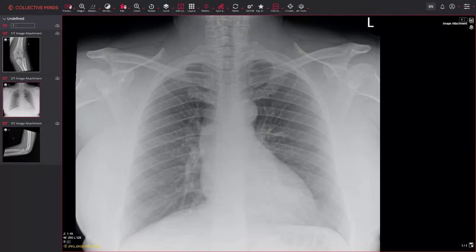But that's it, guys. I think the only other thing on chest, I've mentioned external artifacts, internal, so surgical devices we talked about. Just check for foreign bodies as well, although they're not as common within the chest. Occasionally, you might get patients with lead shot in there or something random. Okay, so if there's something there, just mention it and just put it back on the clinician. You could say there's an unknown metallic density, query internal, and they can correlate with that patient's history and find out what's gone on.